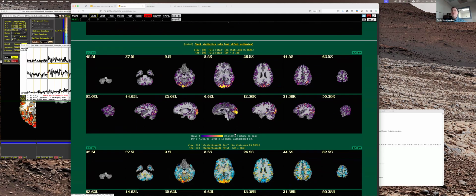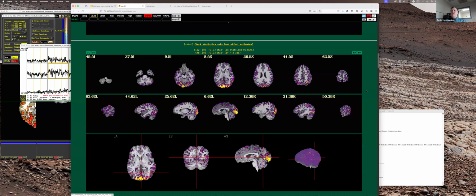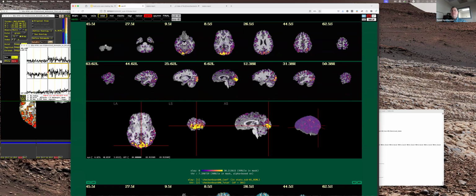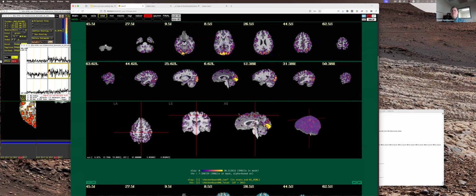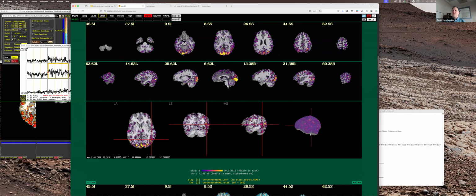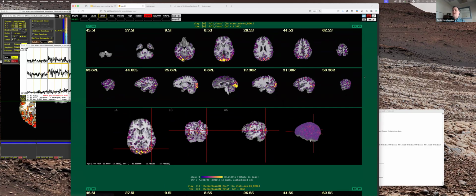Now these are the statistics after all denoising. So this is the F-stat of my block design checkerboard task. And I can see, does it look like where we expect brain activity? I can click this button and open NiiVue right in here and explore more. So like I said, it's a visual checkerboard task. So we got really robust visual response. We also, if I move around, have somewhere around here. There's responses everywhere, but we get a bit of response in motor cortex to signal the button press as well. So this is roughly what I expect it to look like.